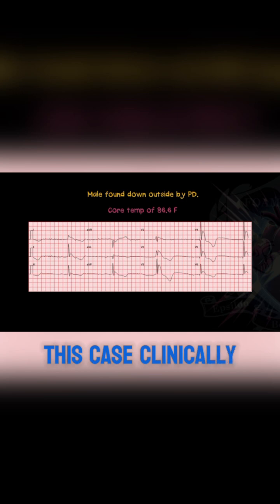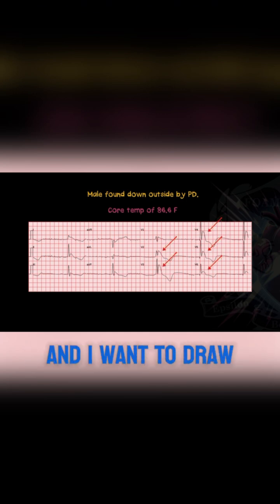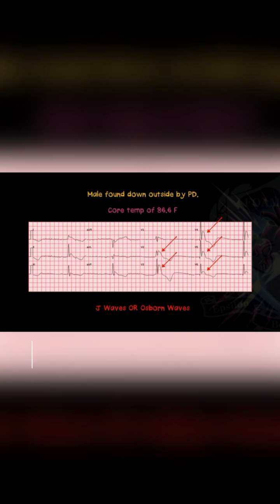Some artifact going on, there's some bradycardia, and to help progress this case clinically, they got a core temp of 86.6, so pretty hypothermic. And I want to draw your attention to these weird waves there at the end of the QRS complex. And for those that aren't familiar, most commonly in hypothermia, we get the presence of what's known as a J wave or an Osborne wave.